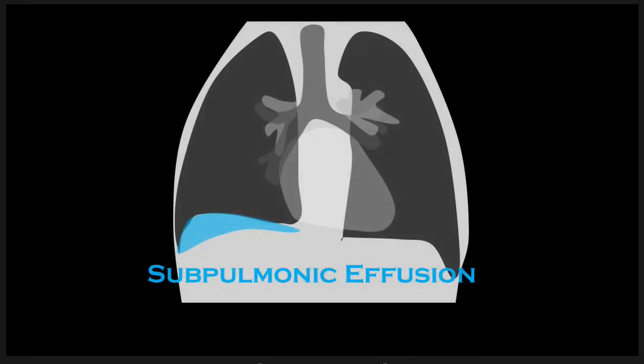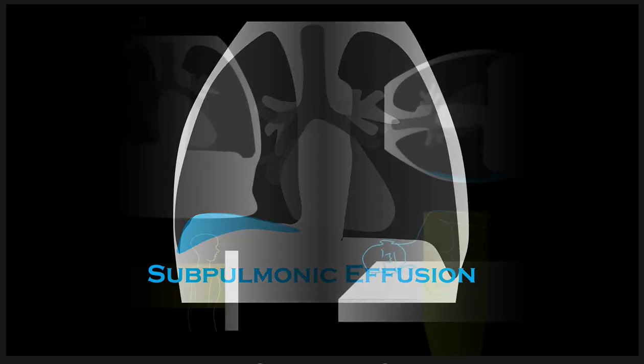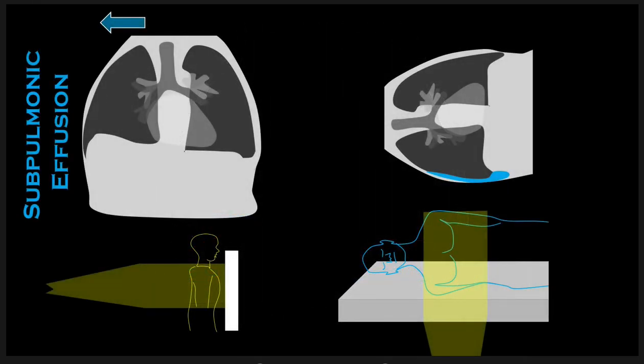There are a few other utilities for this technique. For example, the subpulmonic effusion, which can be quite tricky when you're starting out to tell whether or not that's what's actually going on there. You can also utilize the decubitus positioning on this patient, and again, if it's simple, it should flow and layer out just like that. You can see in the blue.